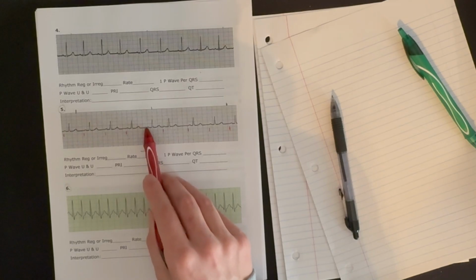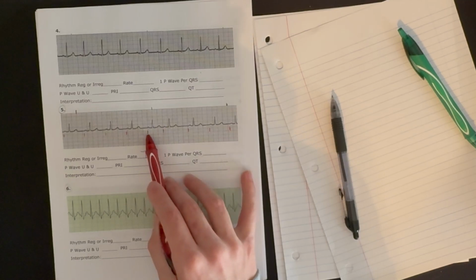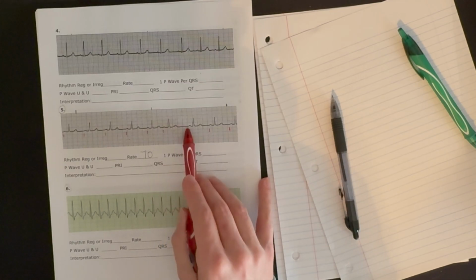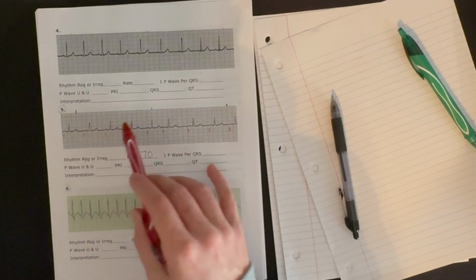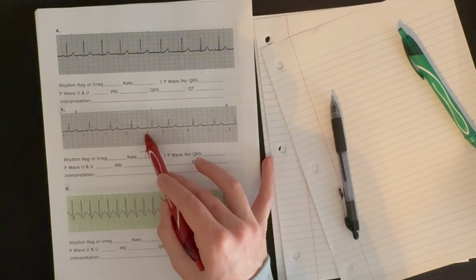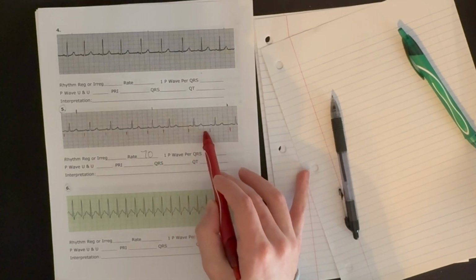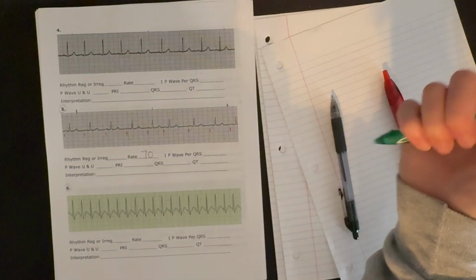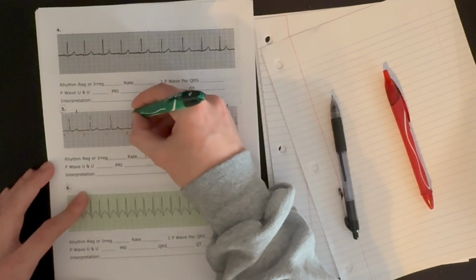This P wave, this atrial contraction, to this P wave, the start of the next atrial contraction, only takes 3 large boxes. And then from this one to the next one takes 1, 2, 3, 4, 5 large boxes. So we were at about a 3.5 large box rate, and then all of a sudden we had the shortening, and then it gets longer, and then we return back to our normal, just over 3.5. Interesting.